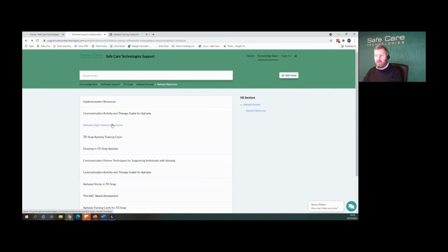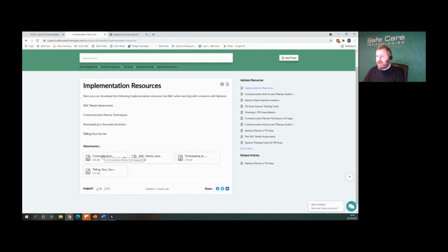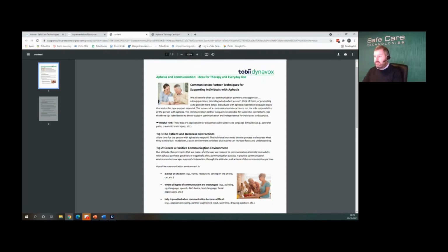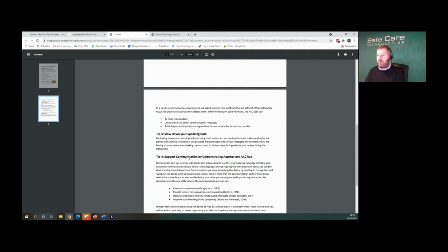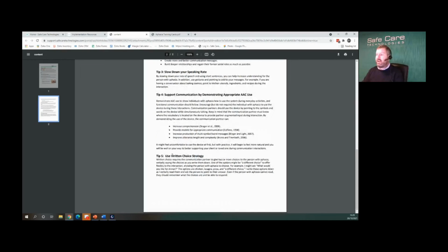more. We've got much more specific resources, like say if I go into implementation resources, and here we've got communication partner techniques. So this might be for a spouse or a family member. How do they, telling us to be patient and decrease distractions. Sorry, a bit of a tongue twister. Create a positive communication environment. So it's just giving some strategies to those people working with or living with somebody with aphasia maybe, and then appropriate AAC use and a strategy, etc.